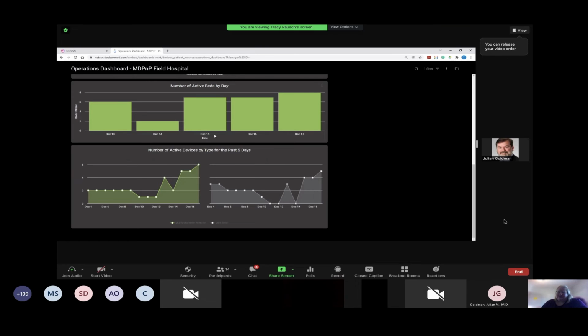And that would give you some additional operational metrics about what's actually happening there and to continue to drill down and drill in. Parts of the future of this will be adding more details around acuity and potentially even ventilator modes, which ventilator modes are being used at each site, for additional information. So that's all. Thank you.